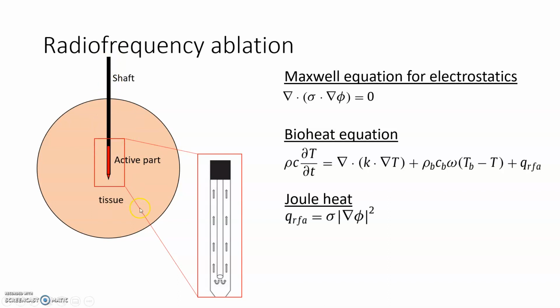The other thing to note is that this RF probe or electrode is usually internally cooled. When I say internally cooled, it means that there's a cooling mechanism inside the probe that can be illustrated by this figure over here. So we have a coolant that flows at the internal lumen of the probe. It flows out from the tip, and the flow in the outer lumen will actually induce some internal cooling to help cool the surrounding tissue to prevent carbonization.